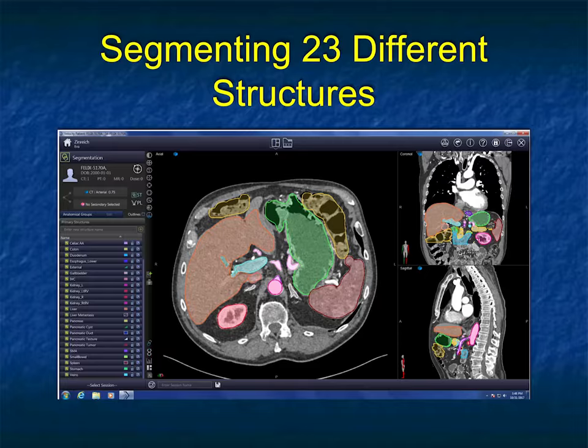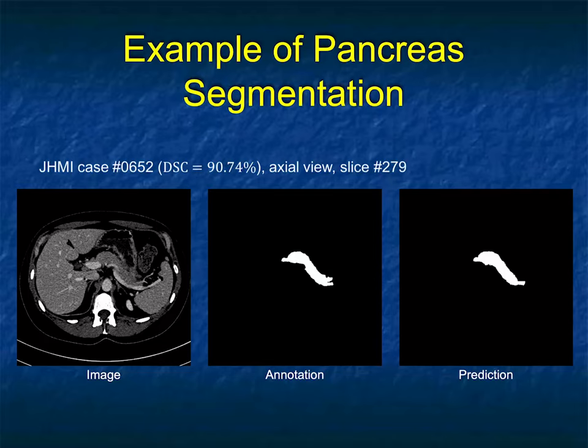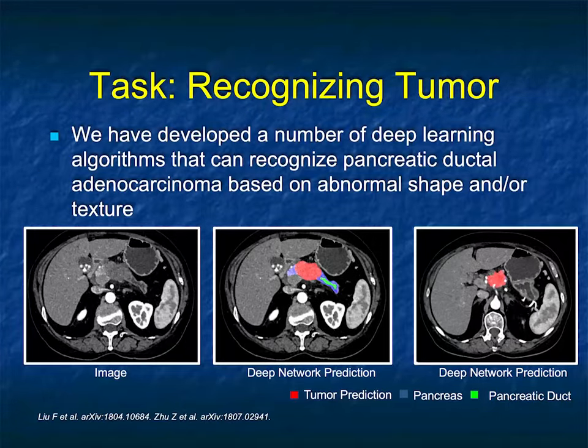We left off last time with this image showing you our training of the computer to be able to recognize the pancreas and various organs. One of the key things, of course, in order to be able to use AI is the computer needs to learn what the pancreas looks like. And here we've trained it, and it's very important, particularly when you want to look at accuracy with radiomics or classic AI, to do exactly the pancreas, no more and no less.